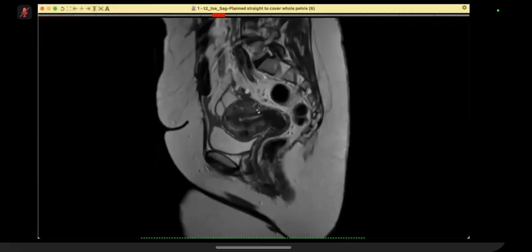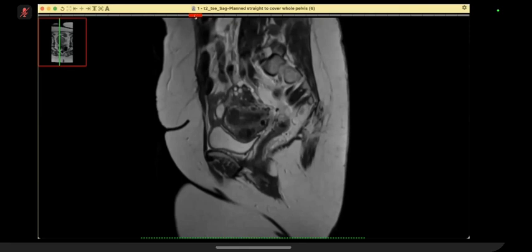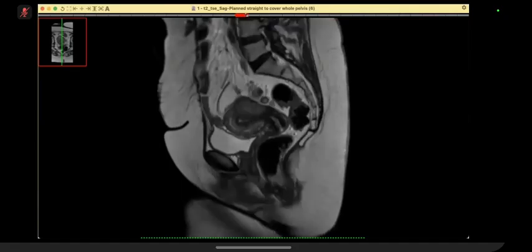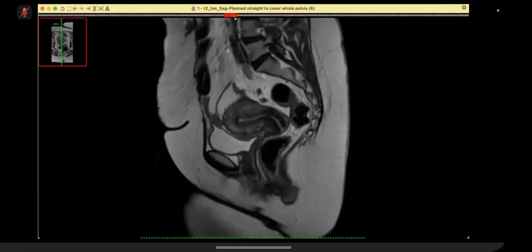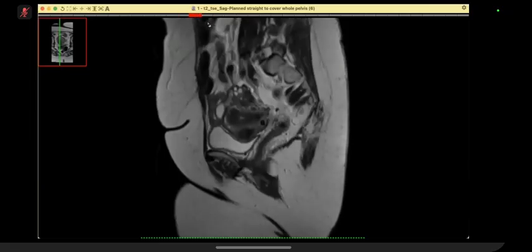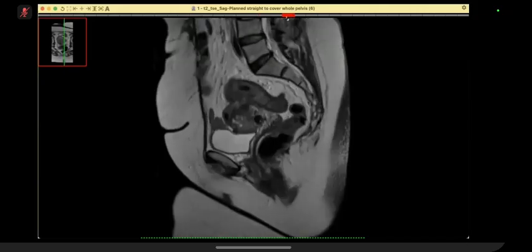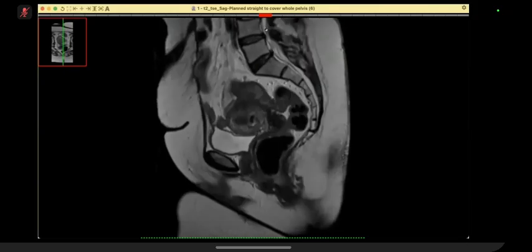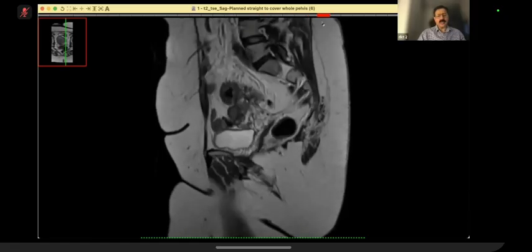Here's the one in the junctional zone. And the rest of the myometrial lesions might be associated fibromas, like leiomyomas. Checking the adnexia, no adnexial lesions, so no endometriomas in the ovaries. And usually I'll check if there are any other deposits in the pelvis. However, I can't see any in the scan, like in the rectum, for example. And would you like to see anything else?